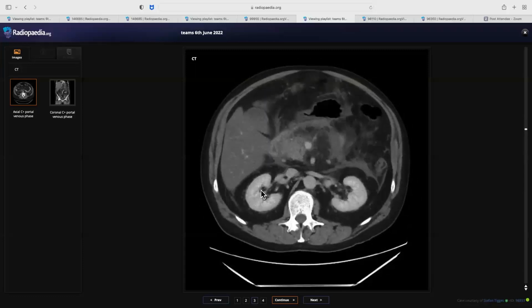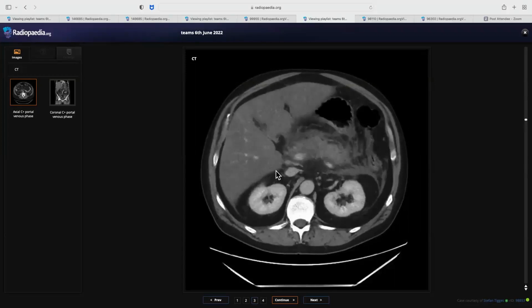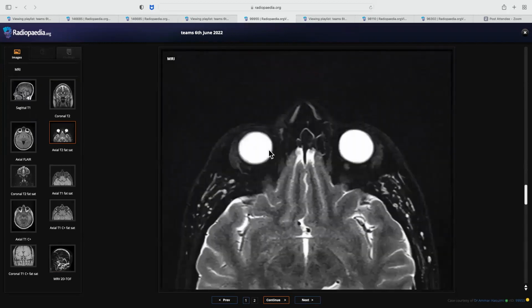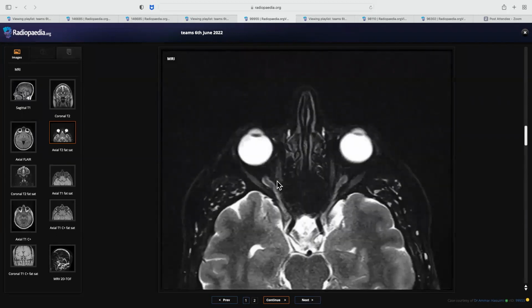And then you have said everything. You even said that you will look for complications, which was very nice. Complications could be necrosis, emphysematous or vascular complications, all those things. Basically, this was for colon cutoff sign. Here, in the previous case, in the distal transverse sinuses, there is some attenuation, though this is very subtle, that's fine. But you picked up this thing. Only thing is, they might not show such zoomed up images.